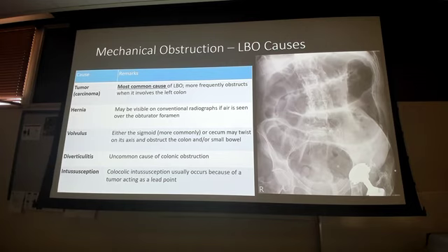It's also larger, but small bowel can be quite dilated. I show that because if you trace this out, it's a weird kind of shape. It doesn't sit nicely, like I told you, when you see the pictures. So you can't really use the shape to determine it. You need to use the valvulae conniventes versus the haustra, and then take a look at the x-ray in that aspect as well. The small bowel will always have those valvulae conniventes.